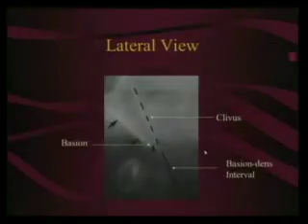Anybody know what kind of film this is? Tom? Big Tom? It's a tomogram. This is a relic. It's from a museum. Okay, not really, but this is one of the ways that we used to evaluate before we had multiplanar imaging. And that's from a tomogram. I thought this was a cool image, just something that y'all never see, just to leave in here so that you can say that you've seen it.